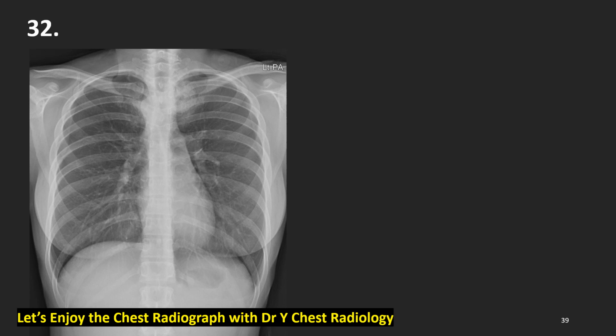Do you happen to remember the cervicothoracic sign described by Dr. Benjamin Felson? It was like that. A neck mass, neck pathology is usually overlying the neck, cervical, and the thorax. That's the cervicothoracic sign. That's not an intrathoracic lesion. That's a neck lesion.